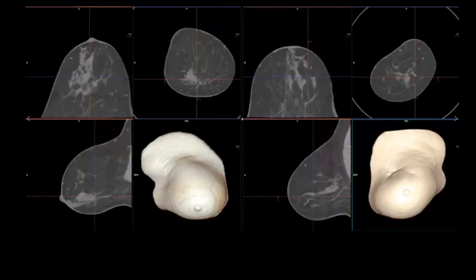And what we came out with is the setup, which is produced by Siemens. Routinely, you see the MPRs in the sagittal, axial, and coronal view. This is actually the right breast and the VRT of the right breast, left side, also in coronal, sagittal, and axial view. And when we're going to start this video, you see that this is dynamic.